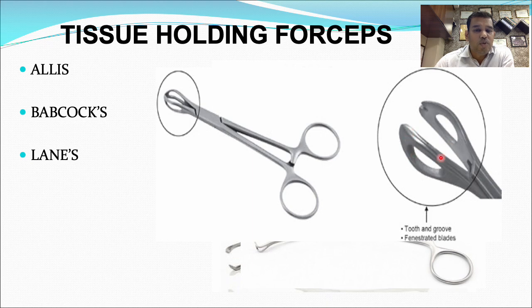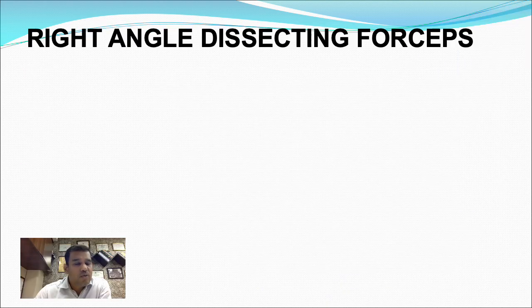So this is also a traumatic instrument. So it cannot hold delicate structures like bowel or ureter or vas deferens or other structures. So you have to hold thick fascias and thick aponeurosis of the abdominal wall to retract. How do you sterilize those instruments? This is purely by autoclaving.